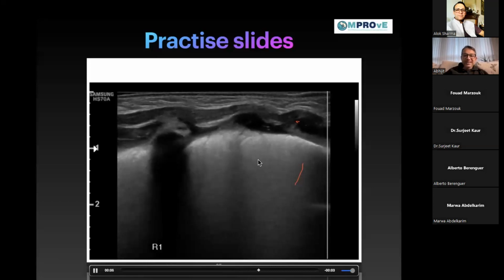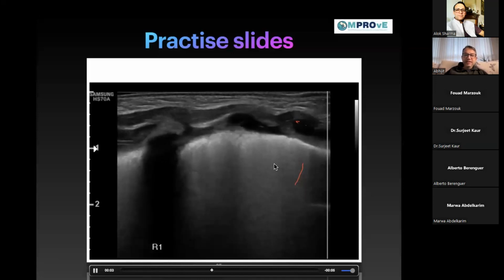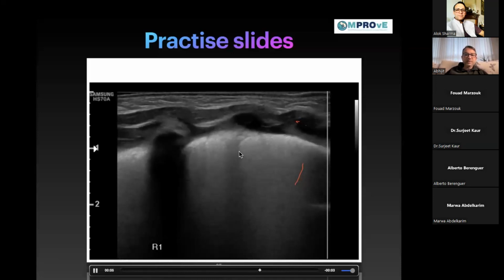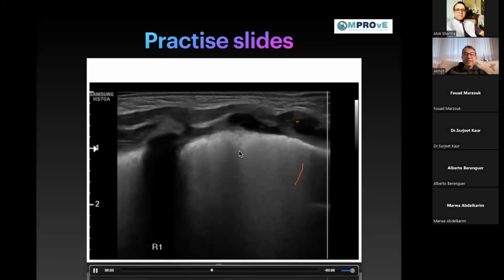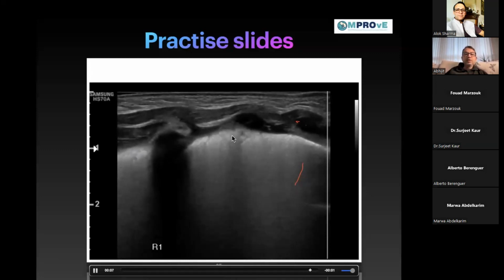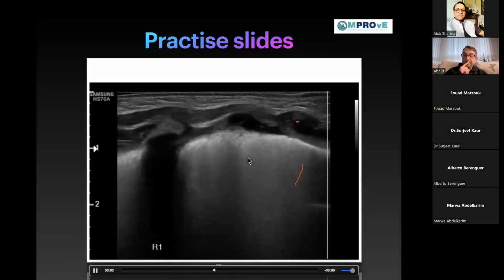I'll not prolong the question answer session here, but the point I want to stress is if you see this kind of picture in entirety in all of the lung zones, irrespective of your oxygen concentration, it might be 25 or it might be 29.9%, it is RDS. If you see this picture uniformly in all the lung zones, this is not TTN.